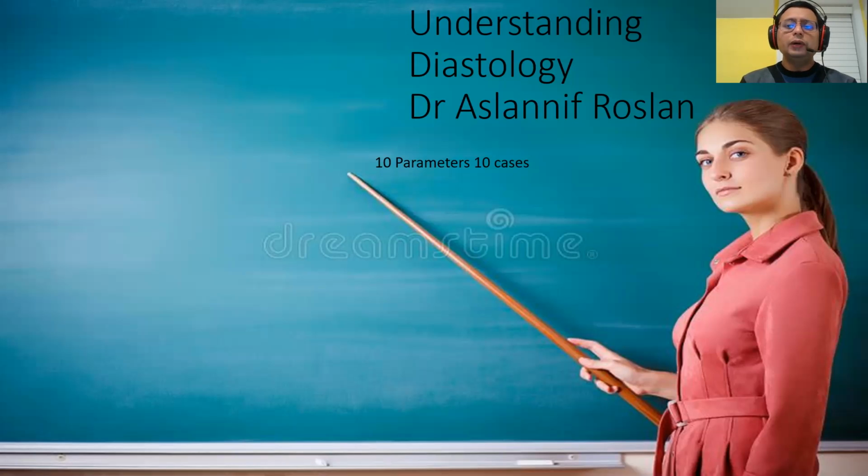These 10 parameters are very important because when you want to assess diastolic dysfunction, they can help you decide whether the patient has diastolic dysfunction or not. And if the patient does have diastolic dysfunction, these 10 parameters can also help determine whether the LA pressure is elevated or not. I will show you the 10 parameters at the beginning of the talk and at the end of the talk, okay?